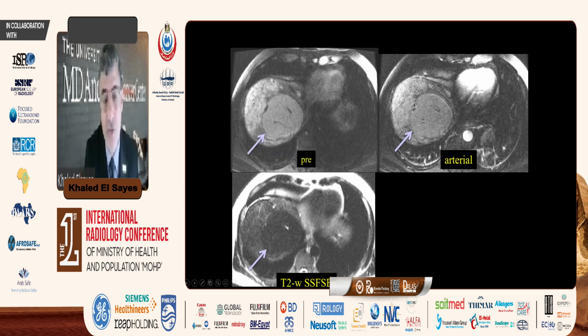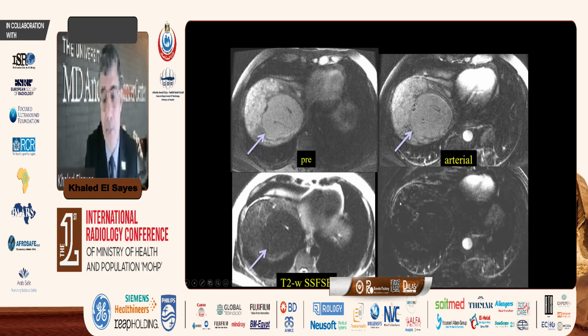That's how you see it in the pre-contrast, and the mass is enhancing, but it's enhancing similar to the surrounding liver. So it's not arterial phase hyper enhancing, it's iso enhancing. There has to be unequivocal greater enhancement than the surrounding liver. Like what we see here, this is not unequivocally greater than the surrounding liver, so this is not arterial phase hyper enhancement.